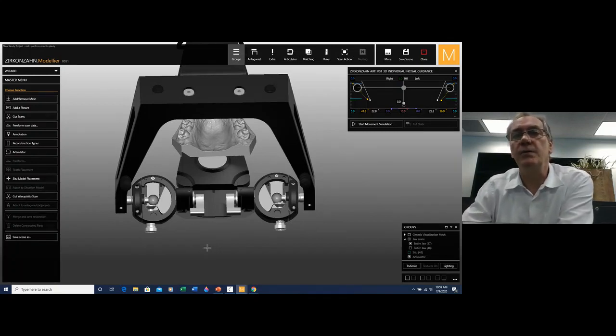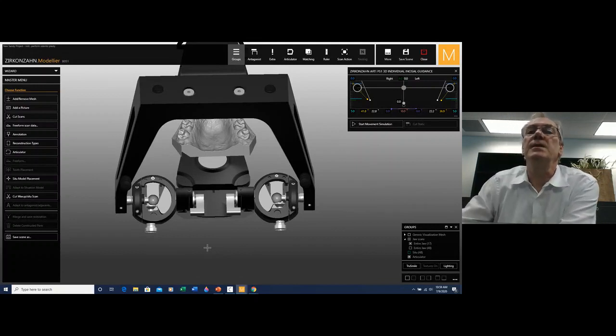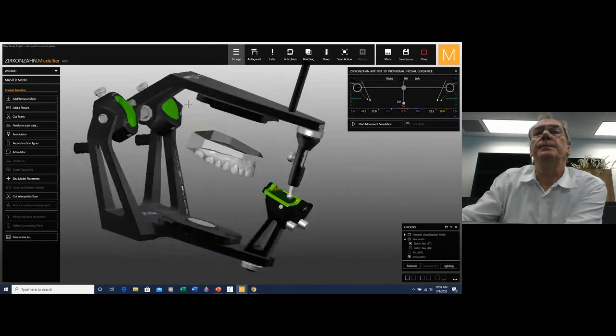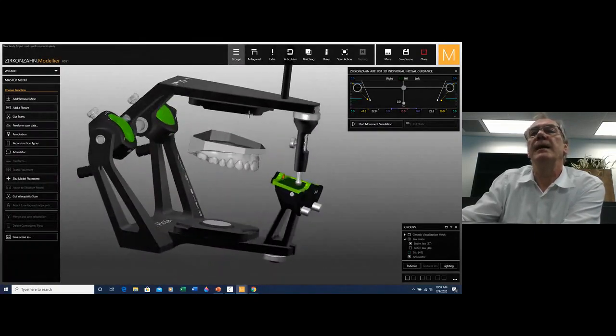So I wouldn't be able to use either the green or the red if my immediate side shift is 0. So my choice is the gray one, and also the eminence will be the gray one, and I set the values according to the gray eminence and set the angle to that position.